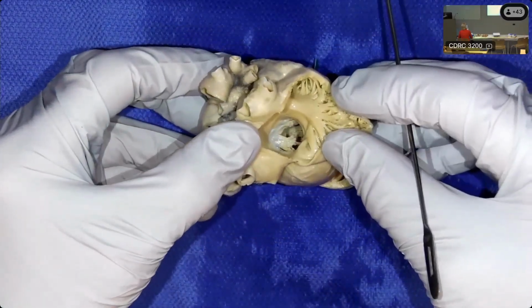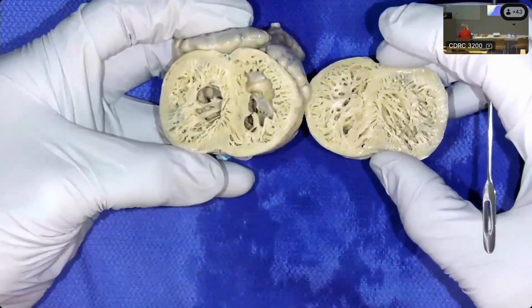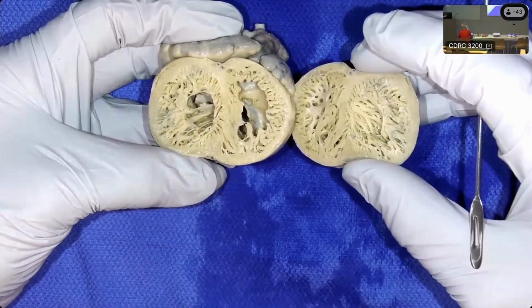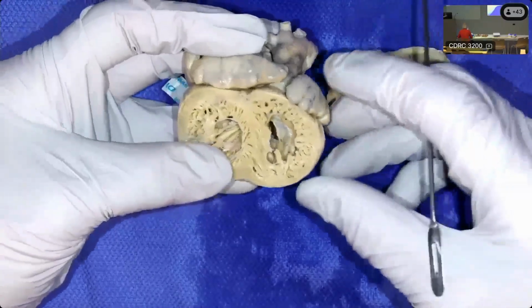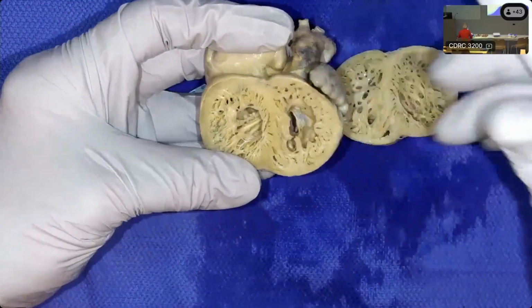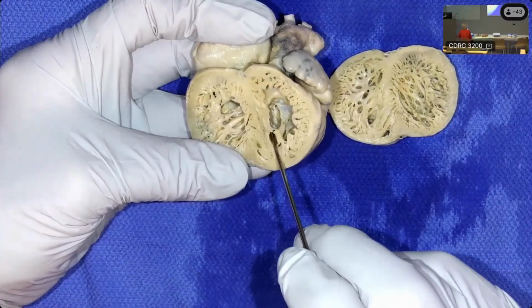And there, if we look at this on short axis, look at the trabeculations of both ventricles. So this is quite impressive with increased trabeculations in both of the ventricles. So here, if we follow the flow of blood, or if we look at the ventricular anatomy, this is a left-sided morphologically tricuspid valve.